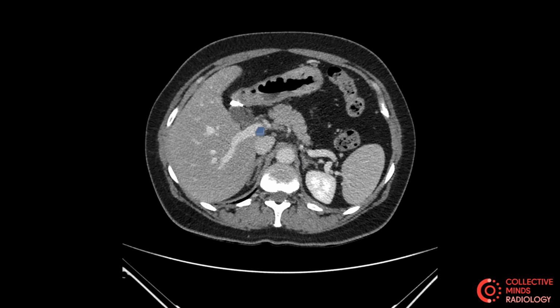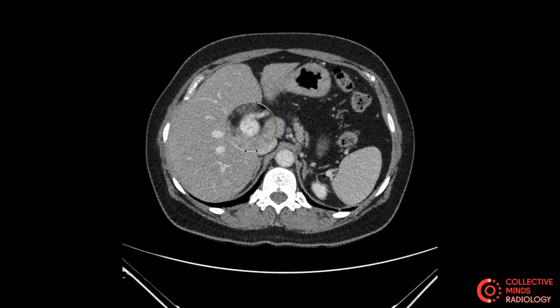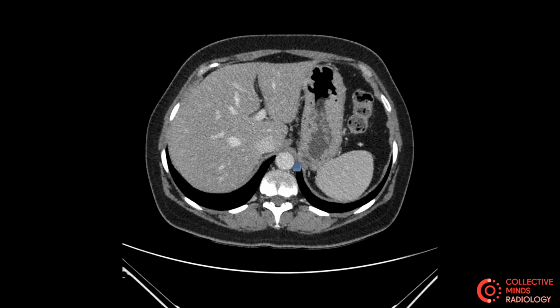And actually, when you look at the portal vein, which is this structure sitting over here, which goes into the liver, that actually looks brighter than the aorta. So this is a study that is actually geared towards the portovenous system, and therefore is known as a delayed phase or portovenous phase study. So we've gleaned a fair bit of information just from the initial few slices.